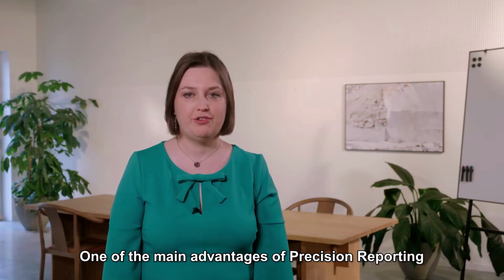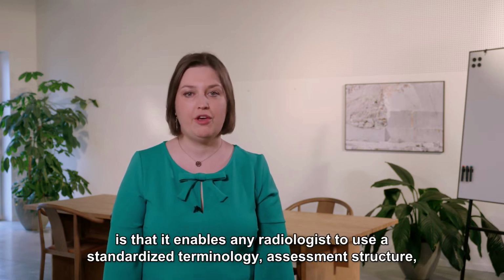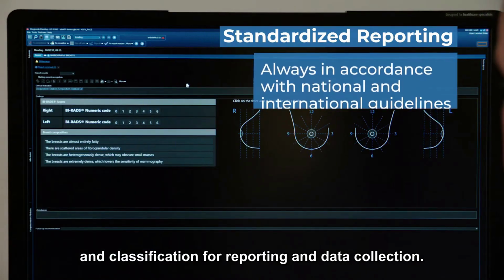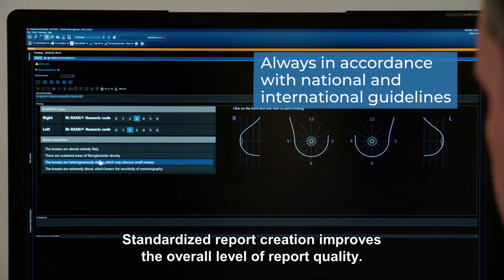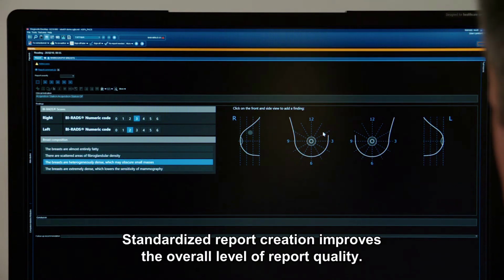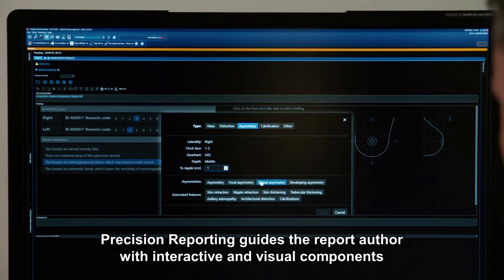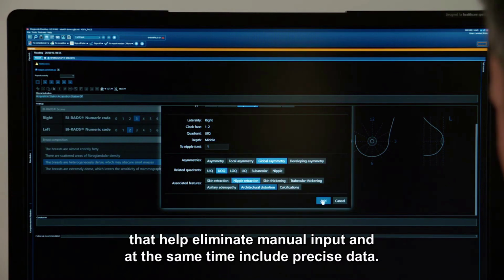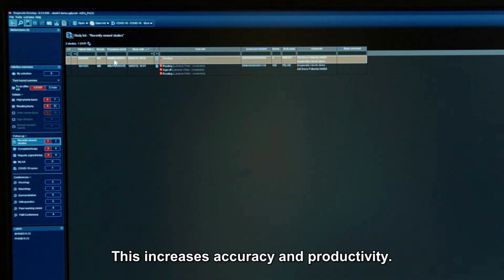One of the main advantages of Precision Reporting is that it enables any radiologist to use a standardized terminology, assessment structure, and classification for reporting and data collection. Standardized report creation improves the overall level of report quality. Precision Reporting guides the report author with interactive and visual components that help eliminate manual input and at the same time include precise data. This increases accuracy and productivity.